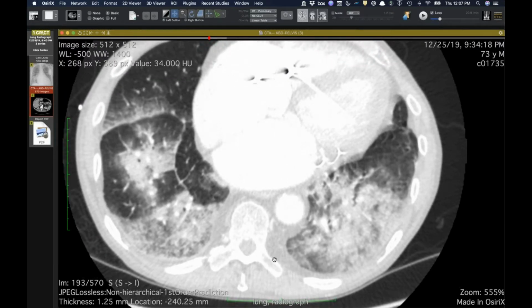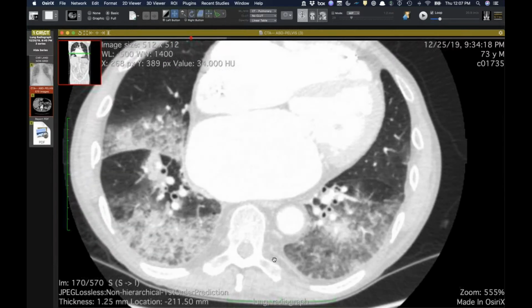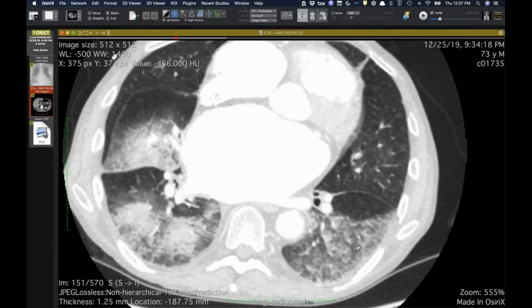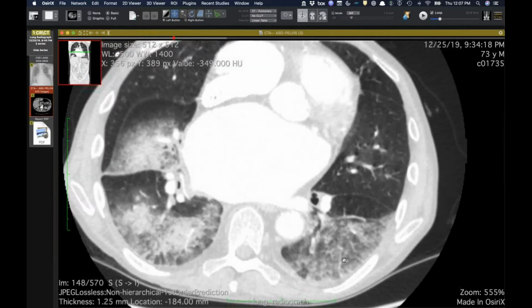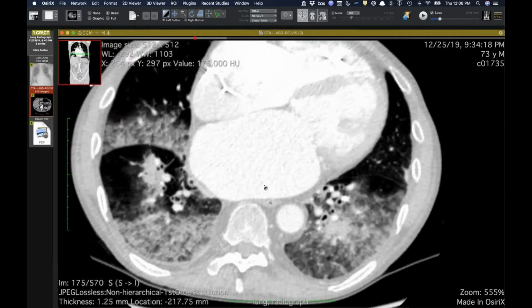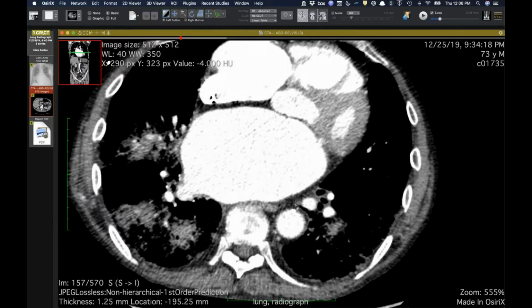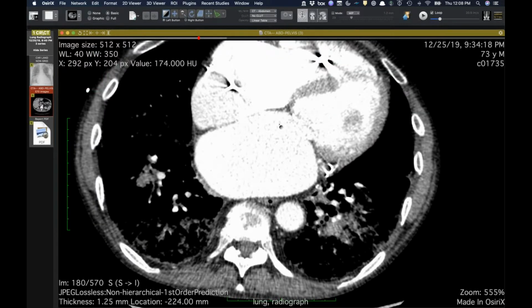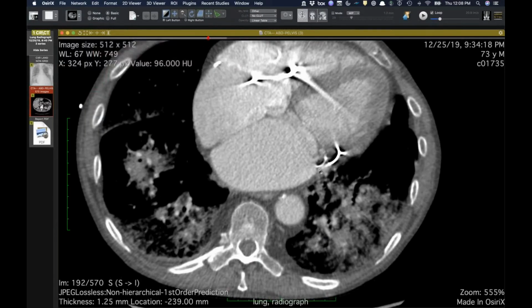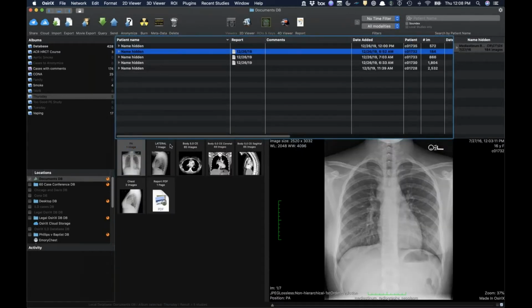Yeah, especially in that left lower lobe up a little higher. You had really nice right there. Yeah, that's a really nice example. So yeah, it's kind of cool because we've seen this before. I liked how they just described it as an intralobular gradient. And this guy, I haven't thought about that before, but now that you mention it, I'll keep my eye out for that phenomenon. Yeah, right. Because I think in his case, he's very tenuous given how big his heart is. And I know, Howard, you've always talked about the stress failure of the capillary membranes when you get an acute rise in hydrostatic pressure. But I just thought that was a cool little image.